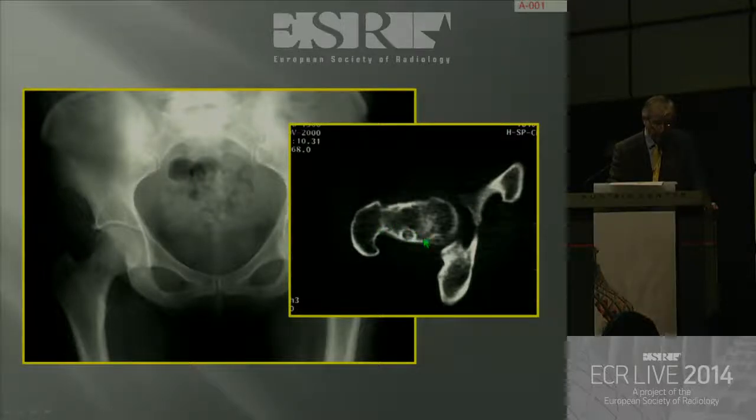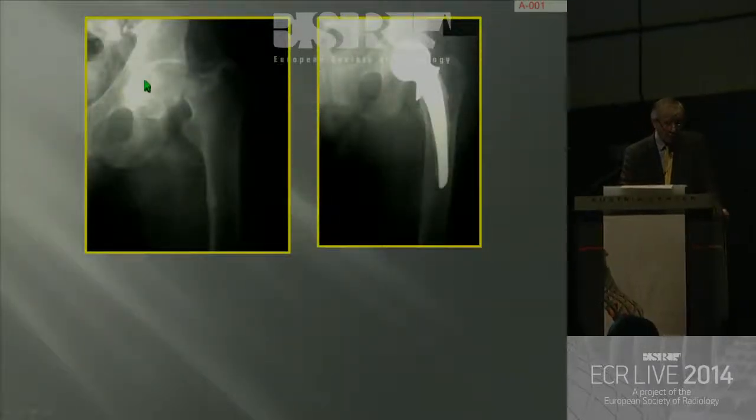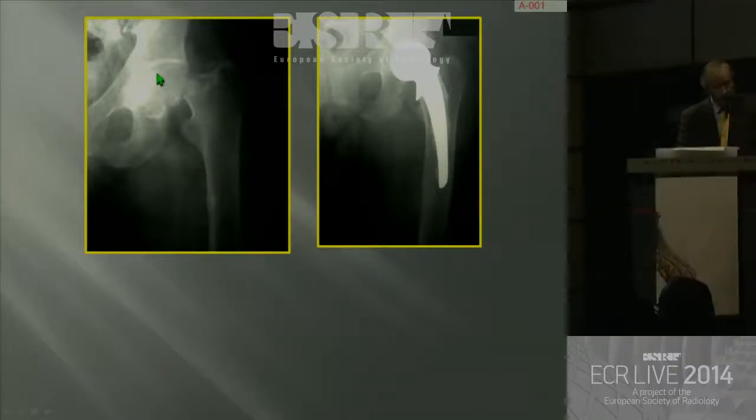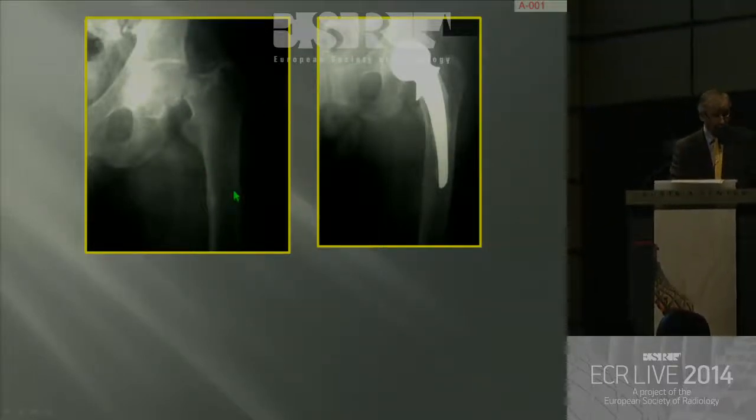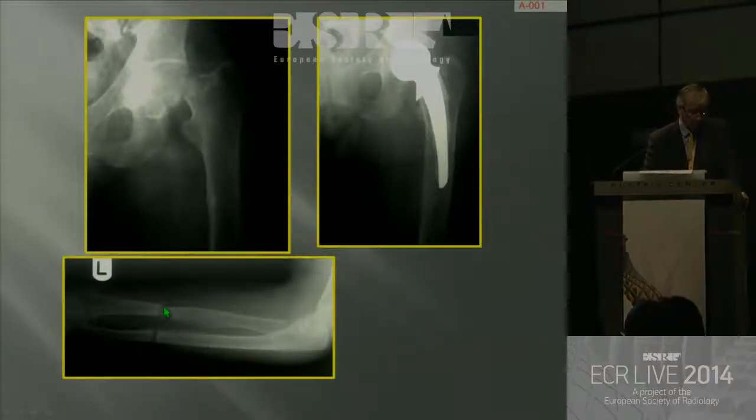And in this case, there is an intra-articular osteoid osteoma. And remember that intra-articular osteoid osteomas may produce a synovitis, which actually produces a localized osteoporosis. And here you can see a loss of bone density, but the outline of the trabecular pattern is not very clear. And so you've got to decide what is happening. There's obviously a fracture. This has been replaced, but the bone doesn't look osteoporotic. It looks odd. And the secret, of course, is this, the looser zone.